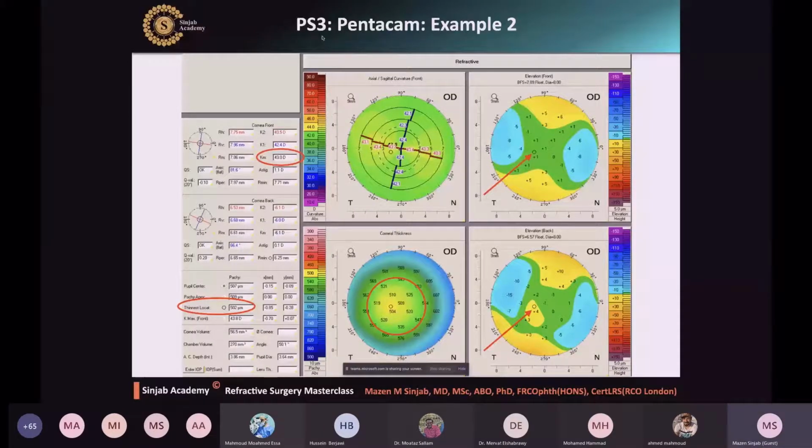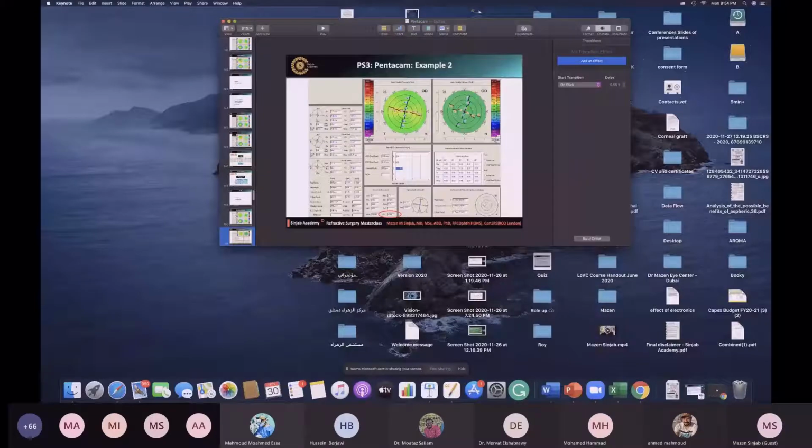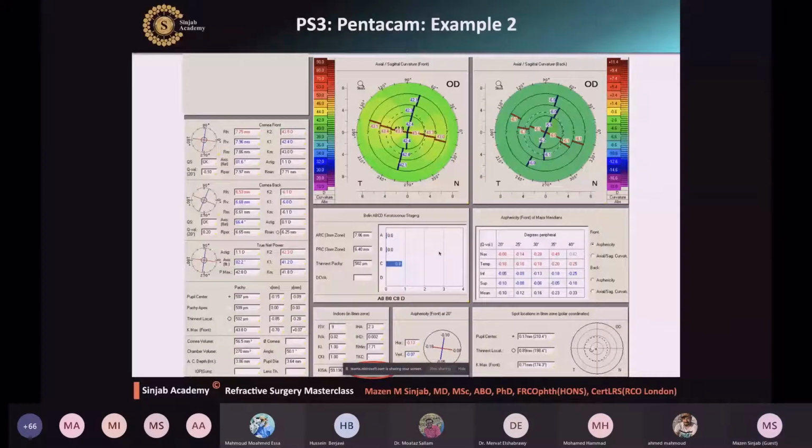And we look at the inferior superior in the Pentacam, and it seems, just a second, because... Yeah. Can you see the number down within the red ellipse? Because I cannot see it because there is something hiding it. However, everything seems fine.